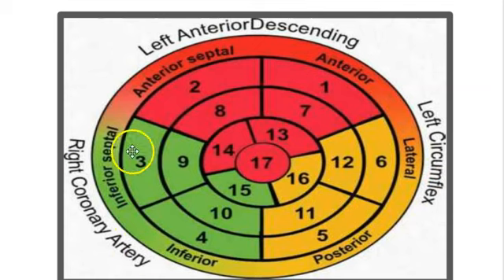So again, you're just looking right down the heart, a bullseye right down to the apex. Picture this stretched out, if you could, all the way down, and these are the different segments, as I explained before, for each different cut plane through the heart.